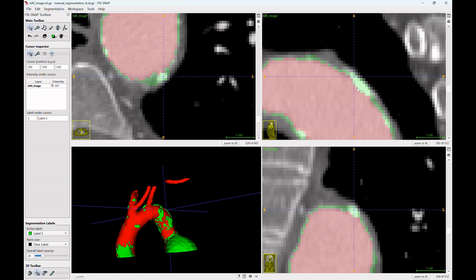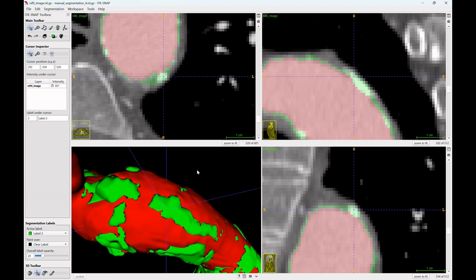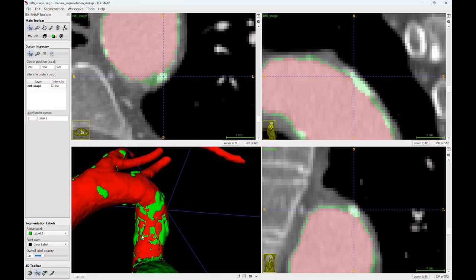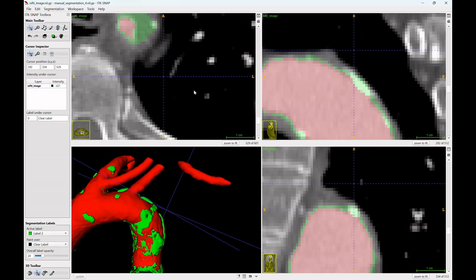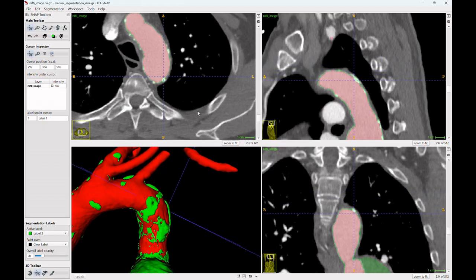It is important to emphasize that a segmentation performed by a single person is difficult to validate on its own. This segmentation represents a first working version, and these corrections will be reviewed during the validation phase. This review step ensures the consistency, accuracy, and final quality of the segmentations.